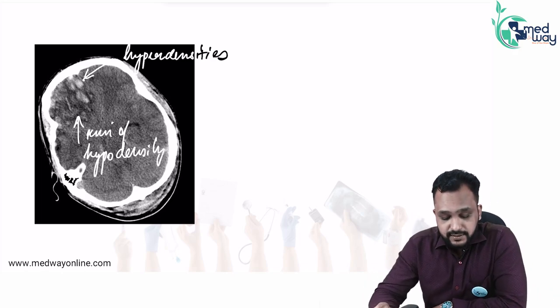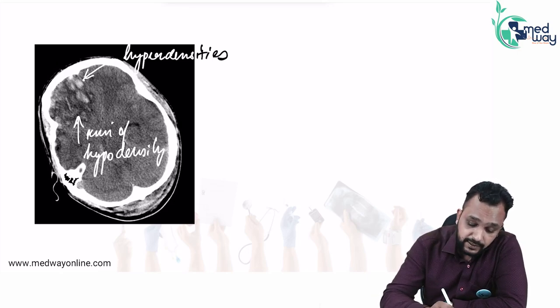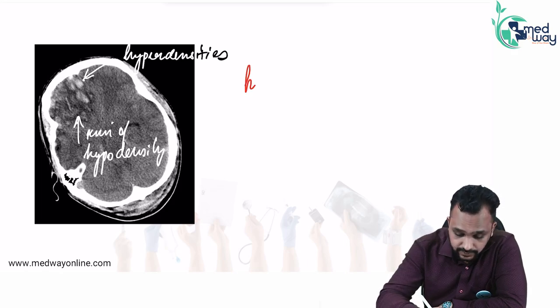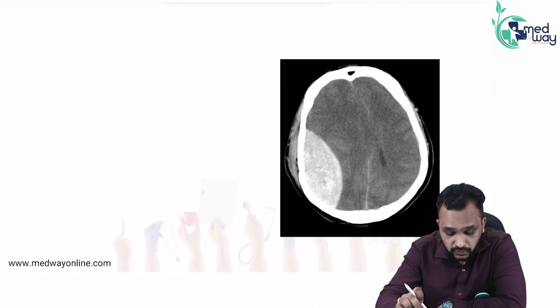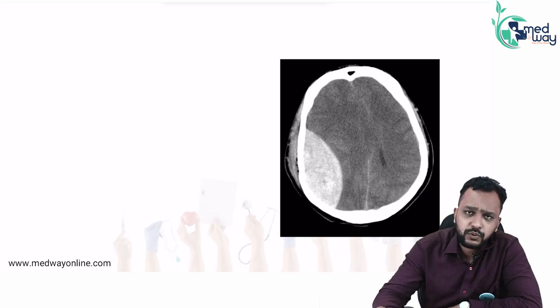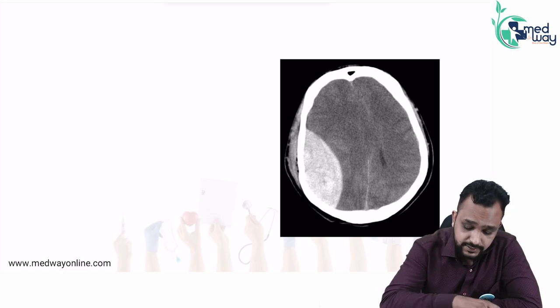Hyperdensity surrounded by a rim of hypodensity means these are intraaxial bleeds, or we can say these are hemorrhagic contusions within the brain parenchyma. Now let us study each of these bleeds separately. What are the various causes? What is the source? Why do they have particular shapes?